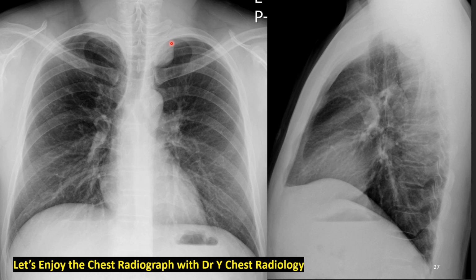This is what we used to call the cervicothoracic sign. Let's look at the lateral film. This is the head of the humerus. The tumor is this one. Yes. It's on the vertebral body side. Yes. It's paravertebral compartment location, probably neurogenic tumor.